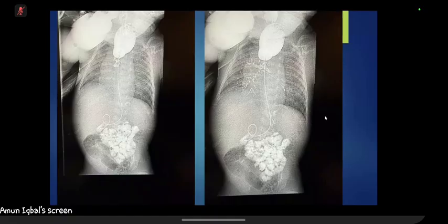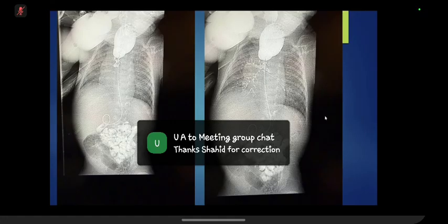So we raise the suspicion of both scenarios: that there could be a residual fistulous communication, and that this could be an aspiration because the proximal esophagus is extremely dilated. So some of the secretions might spill from the upper part of the trachea and go into the tracheobronchial tree, although less likely, but we did raise the suspicion.